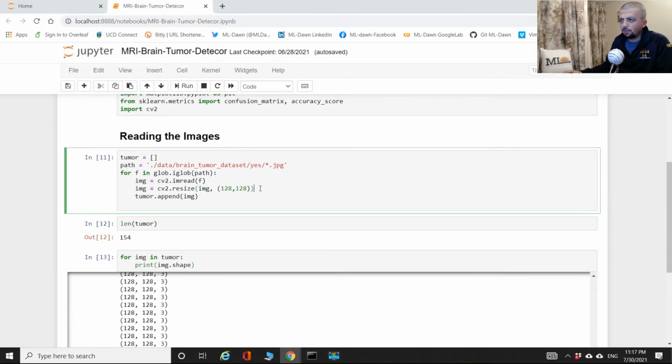Now, the other thing worth mentioning is that sometimes when you use these packages to read in images, if you have multiple channels, which is our case, certain packages will treat those channels in a different way, meaning that they might read them in different order. So BGR or RBG or whatever, or maybe RGB. Just to go with the convention, and also because I'm looking for an excuse to show you more stuff about CV2, I just wanna make sure that the order of those channels is exactly RGB. It doesn't have to be, but it's just a convention, and you see that a lot in machine learning and in the world of computers, that sometimes something is not really that necessary, but because we want to be consistent with the way we do things worldwide, we just follow a convention. And RGB, that particular order, is a convention.